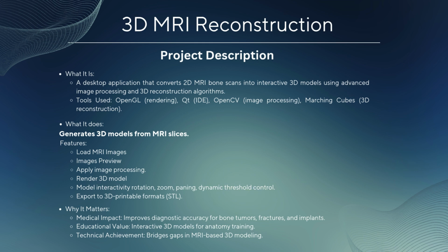Some of the features it offers are: load MRI images, image preview, apply image processing, render 3D model, model interactivity such as rotation, zoom, panning, and also dynamic threshold control. And last but not least is export to 3D printable formats, which is STL.